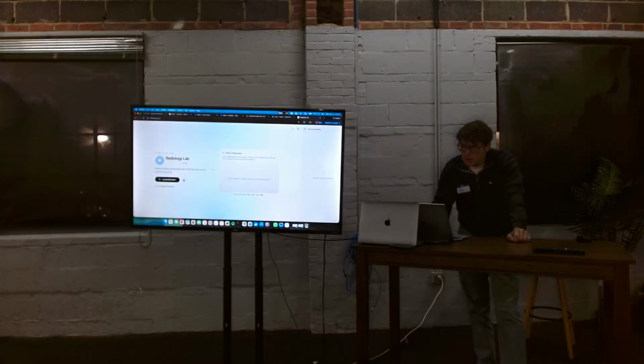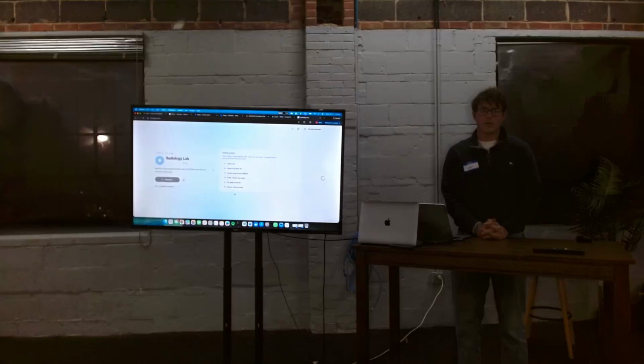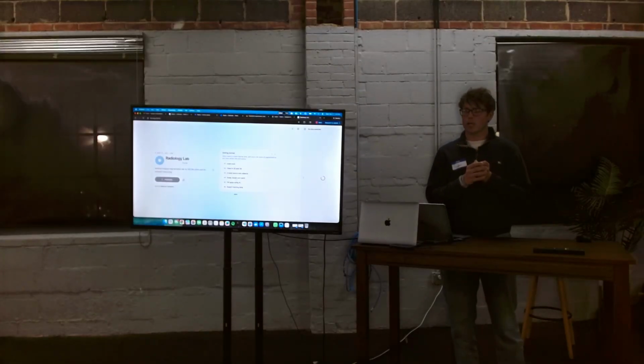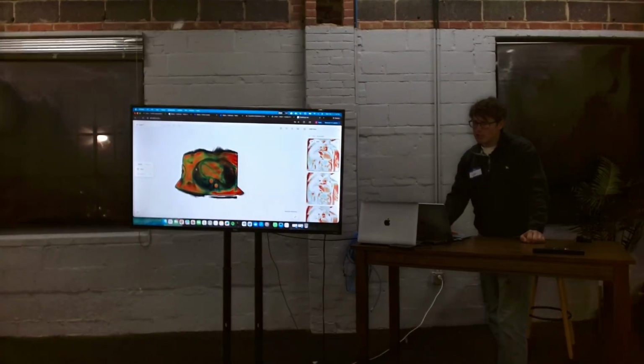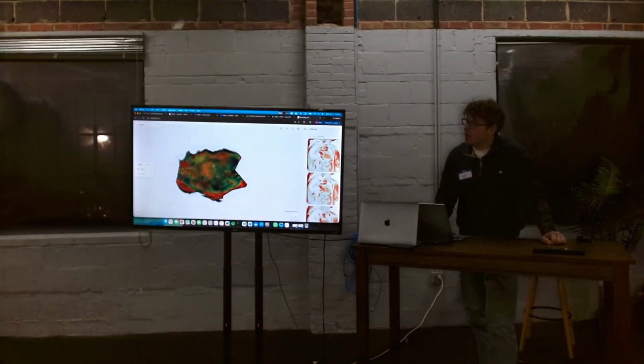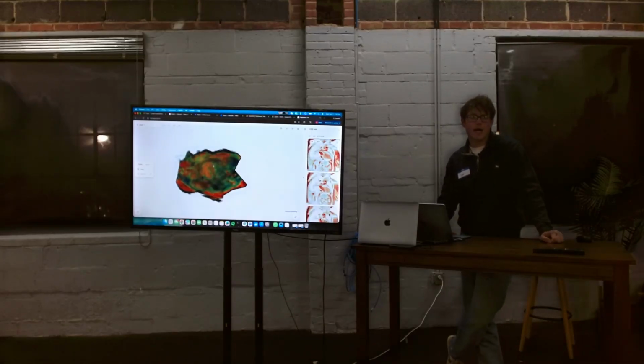And here, I'll load a data set right here. What this takes in is a DICOM data set, which is a very popular medical imaging file format. And once this loads, you'll see right here that I have what's called a volumetric renderer. It's basically a ray marching based shader, all written inside React Three Fiber. And this is a cine heart modality.